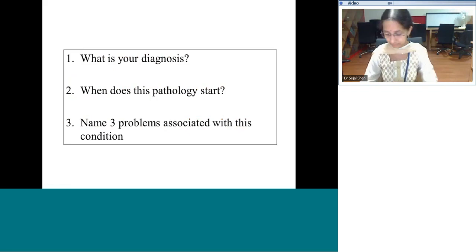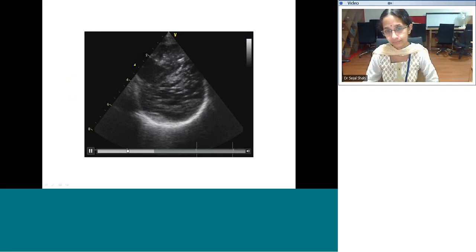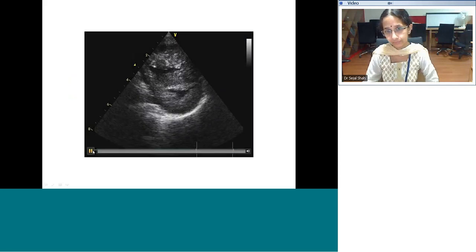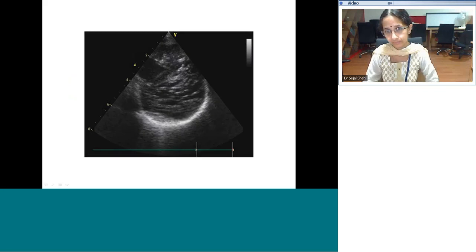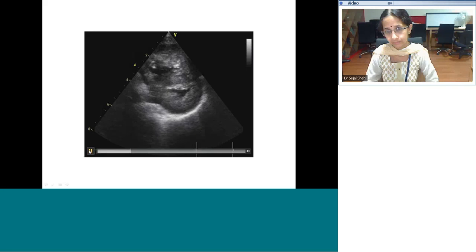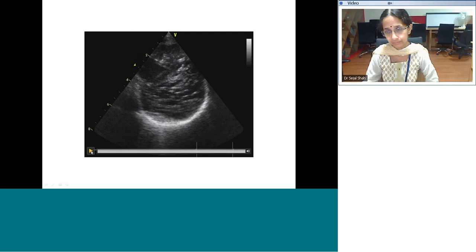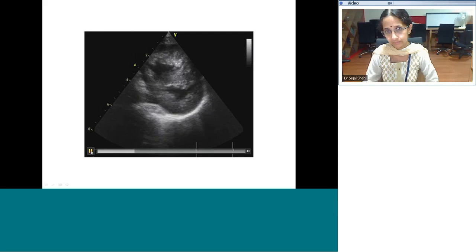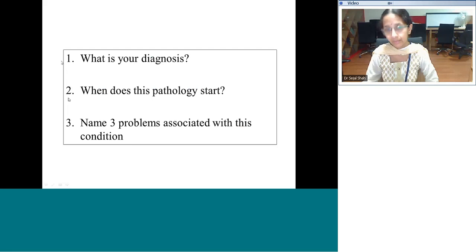Sorry, we'll play it once again. So what is your diagnosis in this child?